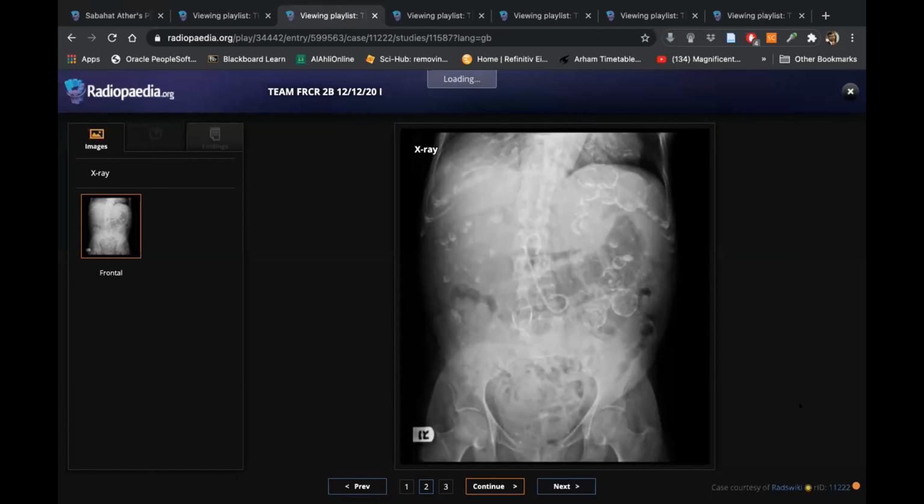So going with this diffuse calcific pattern, I'm thinking of the possibility of peritoneal disease, which can be due to metastasis or any other systemic condition which has resulted in calcified nodes, probably a disseminated infection, like an old healed tuberculosis. So in my usual practice, I will suggest cross-sectional imaging for better analysis and to assess the underlying visceral organs. At the same time, I take the history of the patient to see if there is any history of weight loss or any chronic debilitation.